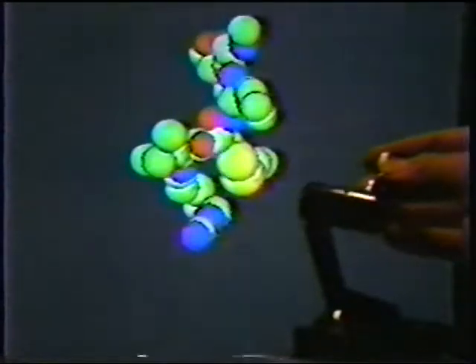Since we can slice away the front surface to give a cross-section view of the artery, they can see the interior as well as the exterior. The earlier version was a 2.5D molecular display, sorting the spheres back to front and drawing each atom as a flat disk painted to look like a sphere. But as the user rotated the molecule, the flat disk popped back and forth unnaturally. During the past year, we've rewritten the program, replacing the painter's algorithm with a pixel depth buffer. Although the new program runs 25% slower, behold. Now the spheres intersect properly and the molecule looks rigid as it rotates.